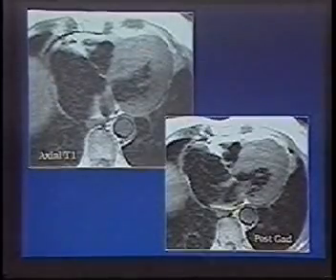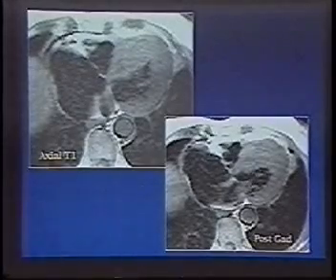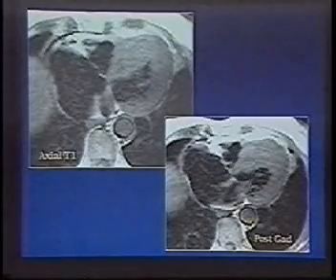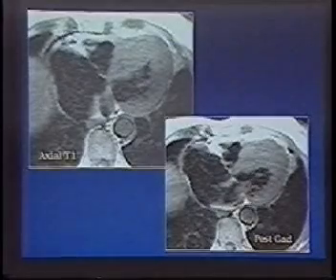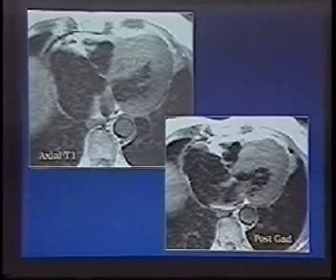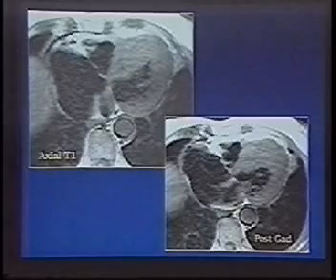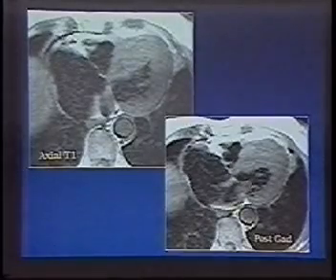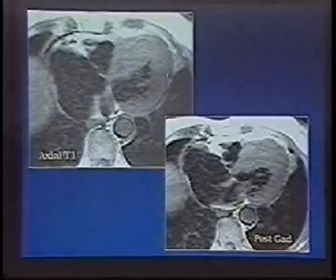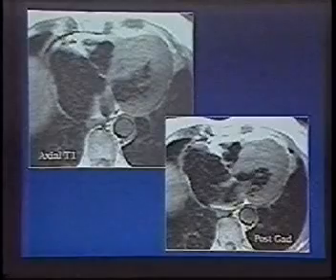So what do we see here? Well, first of all, there's marked thickening of the interventricular septum. So what does that suggest? This is characteristic of hypertrophic cardiomyopathy, IHSS. Hypertrophic cardiomyopathy is usually, 90% of cases have asymmetric septal hypertrophy, meaning the septum is very thick and hypertrophied. The rest of the LV is pretty normal. And 10% have a different distribution, either apical hypertrophy or concentric.